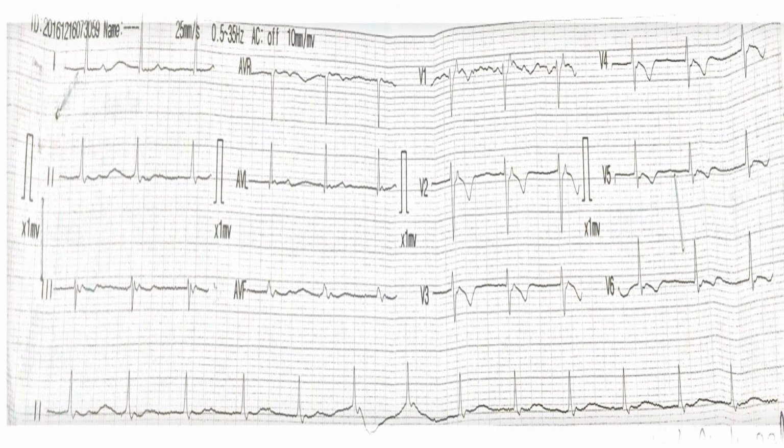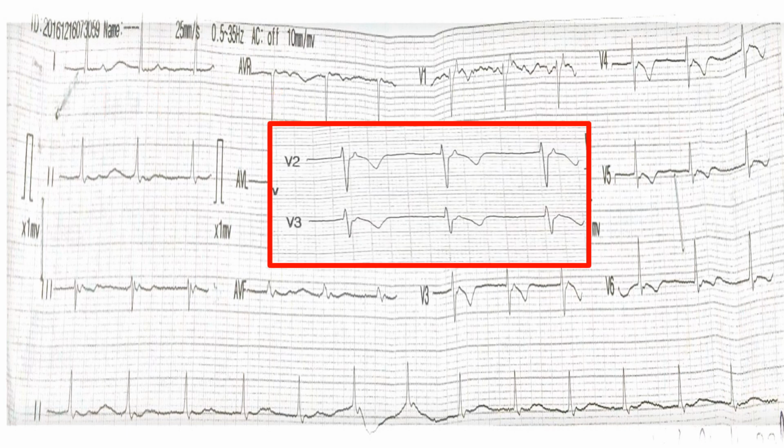So now let's go and see. These are the P waves which I have discussed earlier, and now I have marked them for you as well. So now coming back to the main focus, which is the driver. For that we need to see some things.